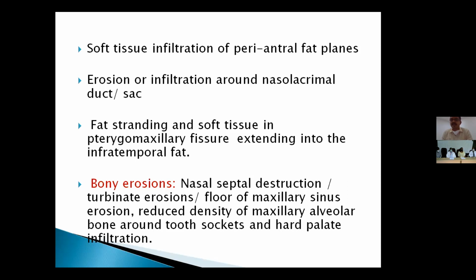Next is fat stranding and soft tissue in the pterygomaxillary fissure extending into the infratemporal fat. This is for finding the extension into the infratemporal fossa. We need to look for fat stranding or any soft tissue present there.